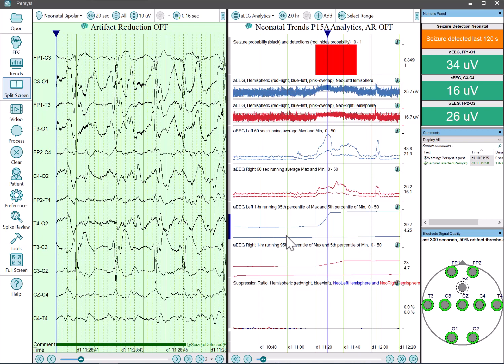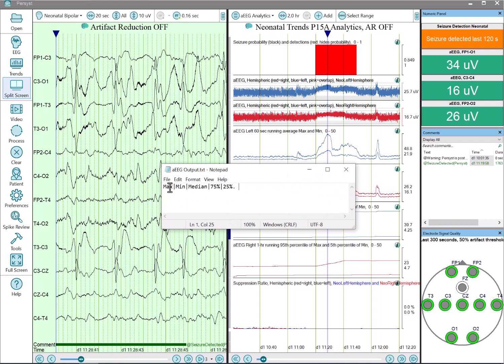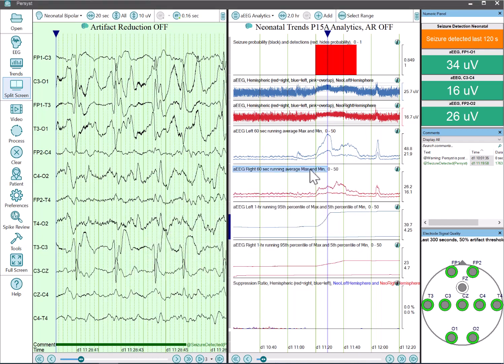Now you can see there's different choices there. For that particular trend type, we can pick any one of these values, and then using a time trend, we can further refine that. So that's how we can get that sort of output. And again, I'll right click over on the right here. We can show the values at the cursor position, but we can also export these to CSV.